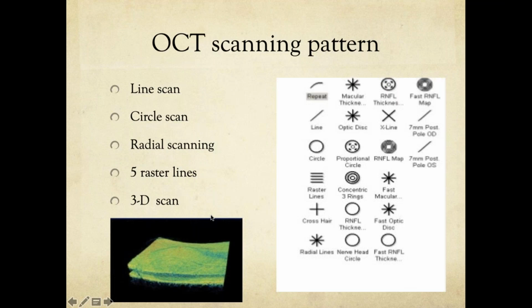So in that retina where you see the central macular thickness of, let's say, 245, but the macular volume is around 10.8, and that patient has just received 2 injections of Avastin and has clinically improved, and you think that further injection of Avastin or anti-VEGFs is not required just because the central macular thickness is 245, then you are making a wrong decision, because you're just looking at a single point. You have to look at the macular volume.